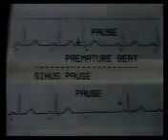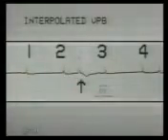Now, before we conclude this chapter, we must see two more peculiar ectopic beats. Here the arrow shows a ventricular ectopic beat. But if you study the normal QRS complex rhythm, it is unaltered. That is, this is an extra beat in addition to the normal sinus rhythm. Till now, we saw that the sinus beat following an ectopic or premature beat is missing.